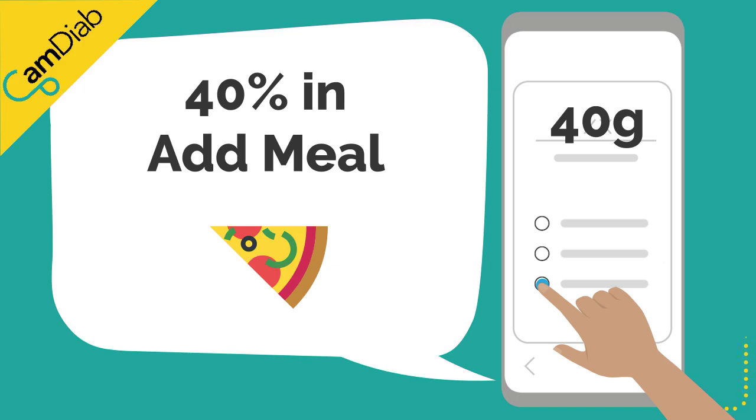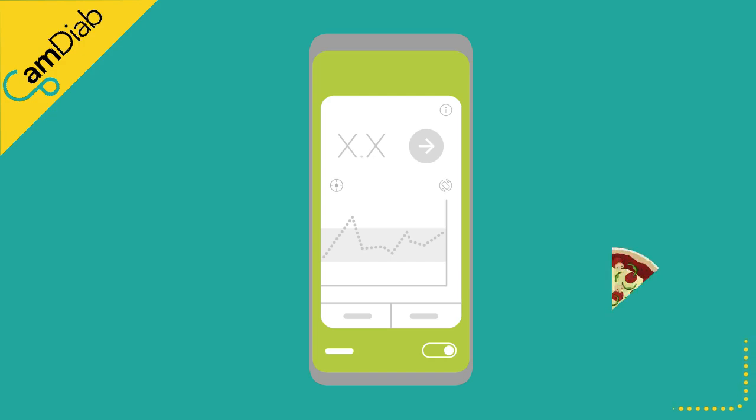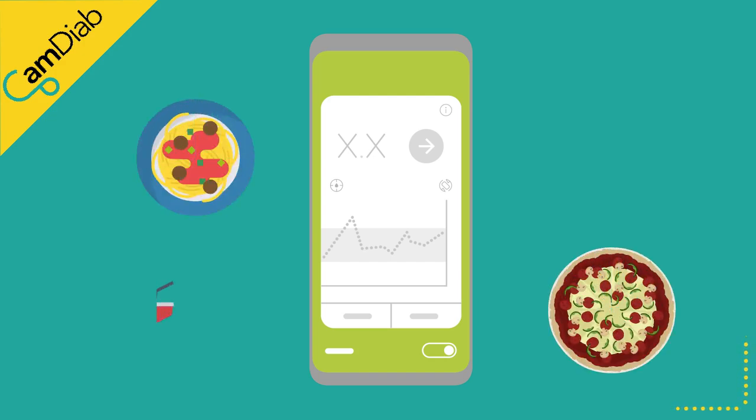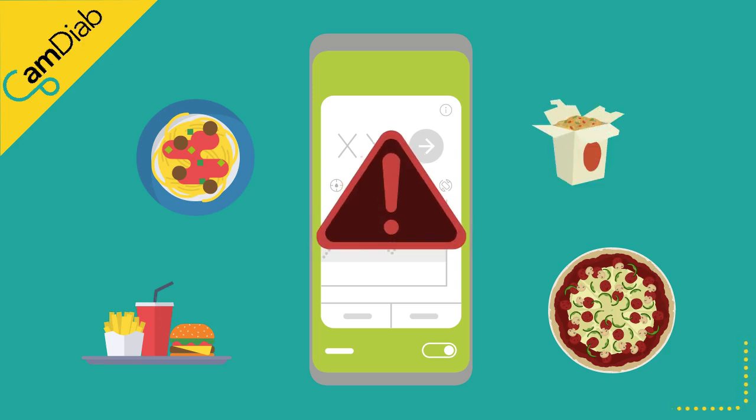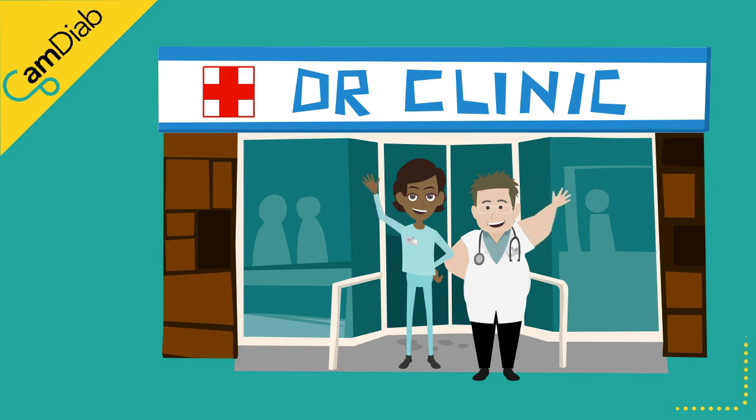You will need to experiment with what split works best for you and the different meals you eat. Please note that this option will not work well if your insulin to carbohydrate ratio has not been optimized. Please seek advice from your diabetes team when necessary.